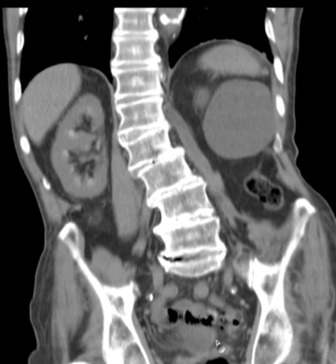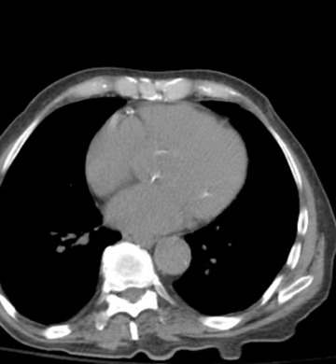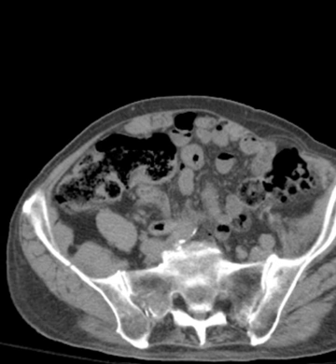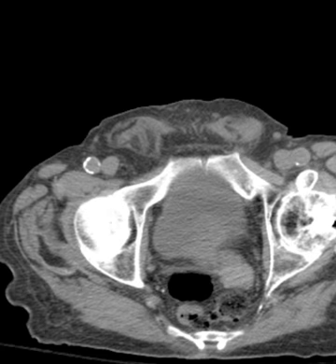But here anyway, for the benefit of just the anatomy, you can see that here's the bottom of the urinary bladder, and off to each side you see a little bit of the seminal vesicles. And in this case, the seminal vesicles are of increased attenuation. The one on the left is, at least, and it's bigger, and that is due to hemorrhage. Unusual.